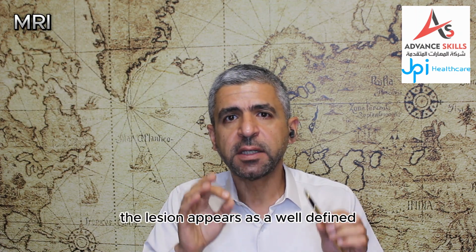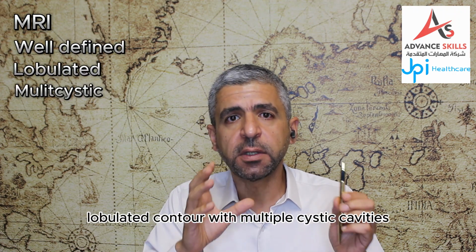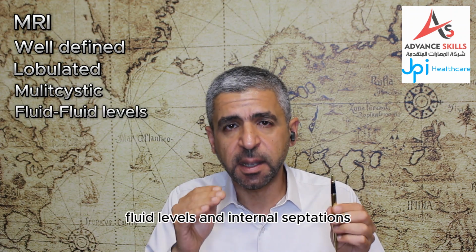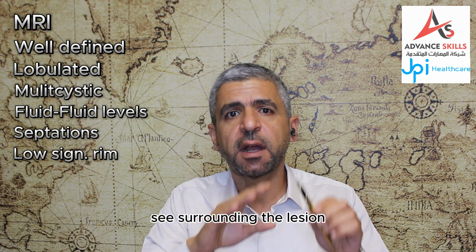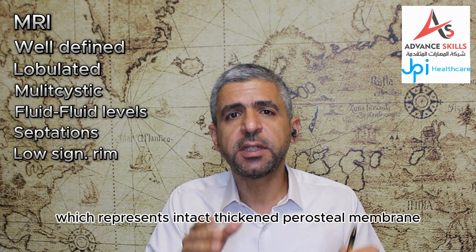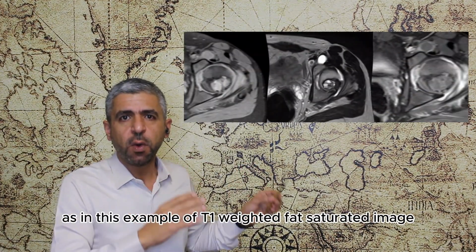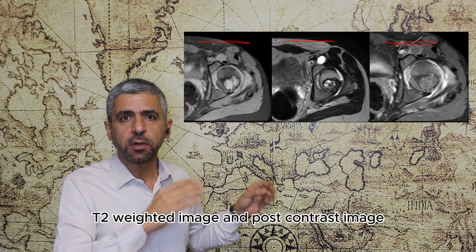The lesion appears as a well-defined lobulated contour with multiple cystic cavities with multiple fluid levels and internal septations, and a rim of low signal intensity seen surrounding the lesion, which represents intact thickened periosteal membrane. As in this example of T1 weighted fat-saturated image, T2 weighted image, and post-contrast image.